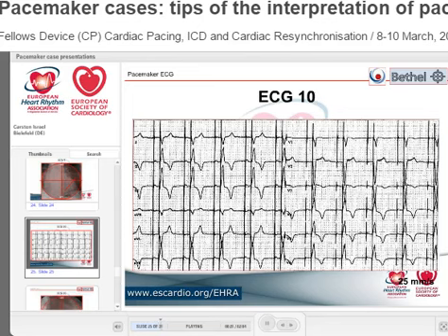Somebody says in the septum, and somebody says in the outflow tract. Where's the outflow tract? Is it upper part of the heart or lower part of the heart? Okay, the outflow tract, left and right, are in the upper part. So if you pace in the outflow tract, the stimulus travels down. So 2 and 3 must be positive, and they are.